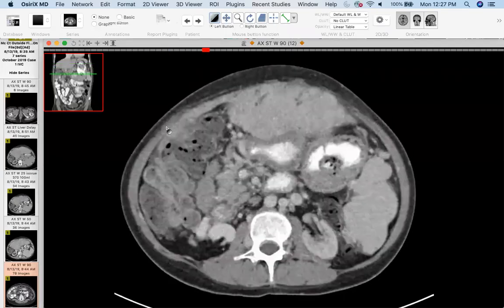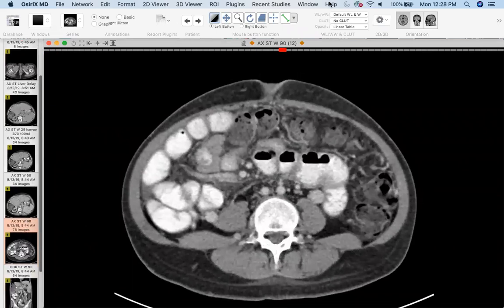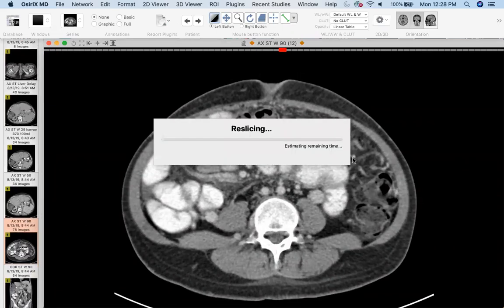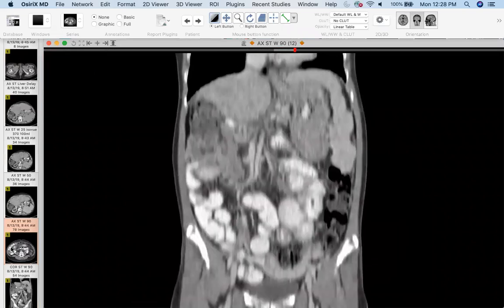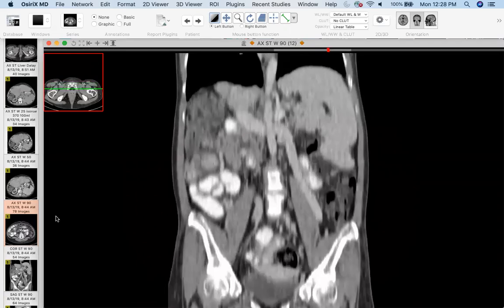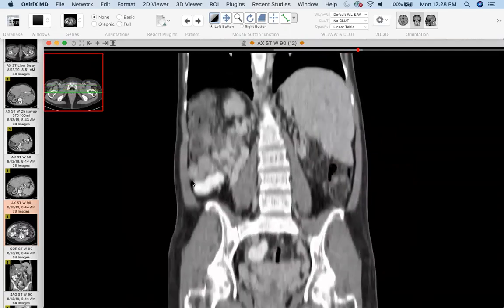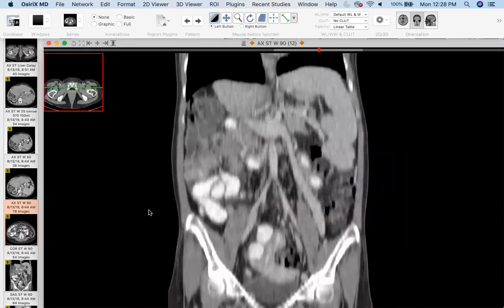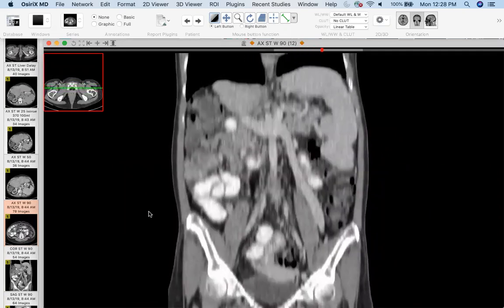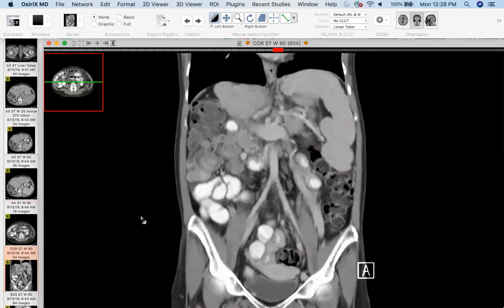So this is a patient who has cirrhosis, and they're just doing like a screening HCC protocol. But I want to show you, it's a congenital anomaly of the veins. Any thoughts, Victoria? Is it the Abernathy one?